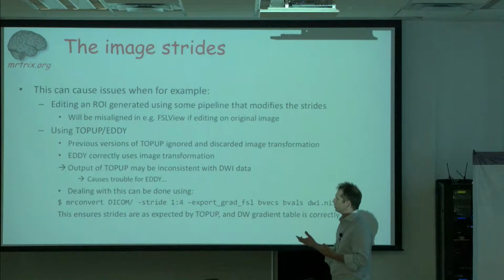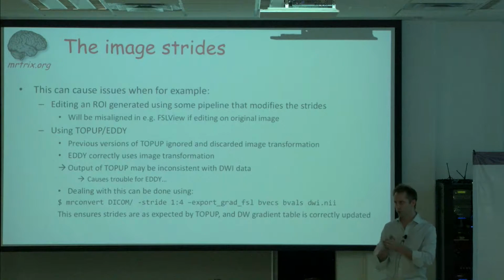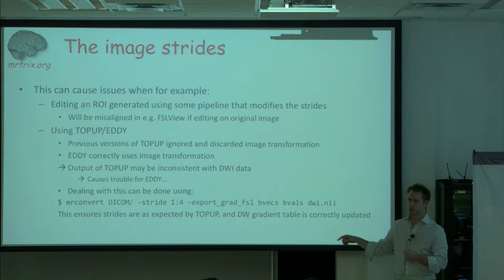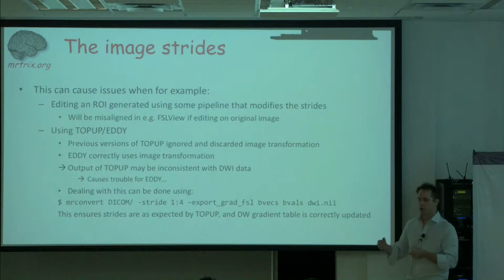Commands that output data where it's important to have it in a certain layout will do so. So for example, dwi2fod will use volume contiguous storage for the output if it can. With the MIF format it can, with Nifti, unfortunately, it can't. And that's useful because then the tractography runs faster.